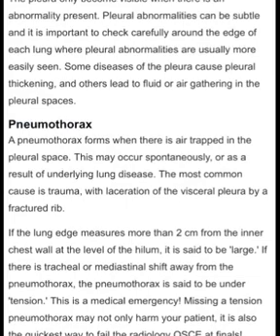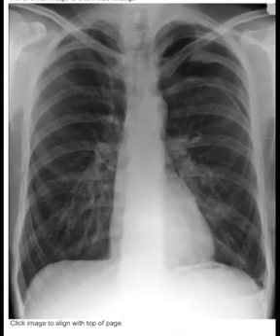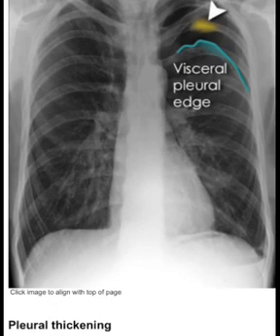Now, pleural disease and pneumothorax. Pneumothorax, visible pleural edge, that is blue line, lung marking not visible beyond the edge. Clinical information: this is due to fall from the height, trauma to the chest. Diagnosis: left pneumothorax due to a rib fracture, that is the arrowhead, and the trachea and mediastinal structures are not displaced, so there is no tension.